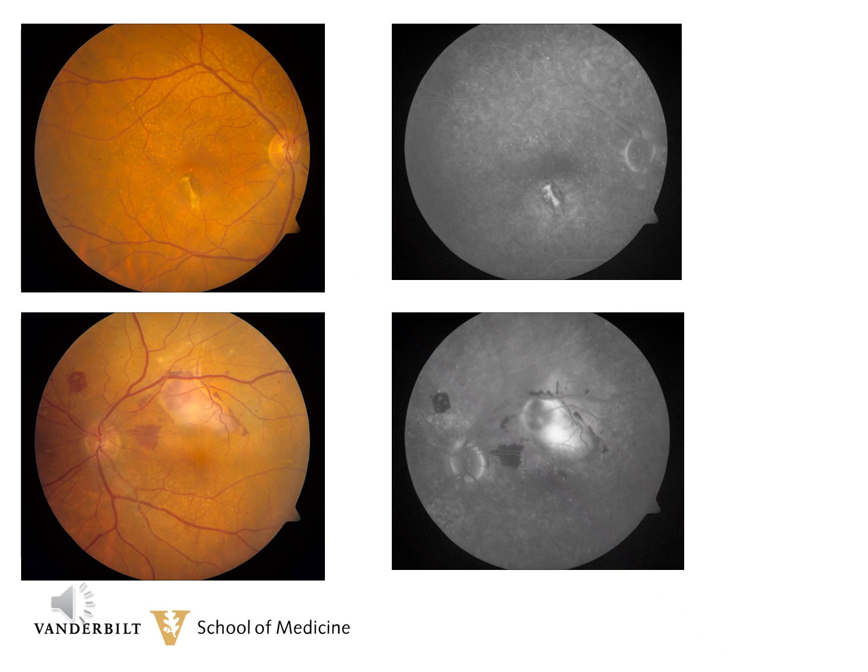The left eye is a different proposition. You can see in the superior macula a very white-looking lesion. This is not edema, this is not preretinal fibrosis, this is not cotton wool spot. This is subretinal fibrosis. You can also see various areas of subretinal hemorrhaging, which states that this lesion is in the active phase. The fluorescein angiogram shows blockage of dye from the hemorrhaging and hyperfluorescence from the new vessels in the scar, and some hyperfluorescence also from the staining of the fibrotic tissue accompanying this lesion.